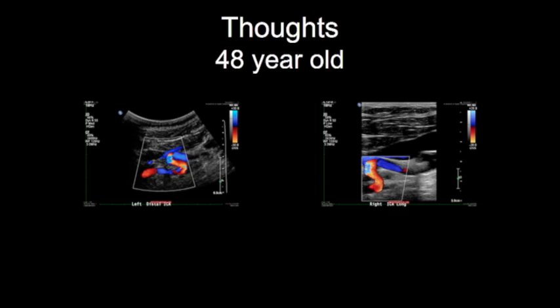So everybody recognize that? I'm going to need some feedback from you guys here. It's almost time, and you're probably all drooling at this point, and falling asleep. But I kind of need you awake to give me some positive feedback here. Everybody sees the sigmoid shapes? Okay, did everybody notice the age of the patient? Does anybody have a diagnosis for me? Pardon?